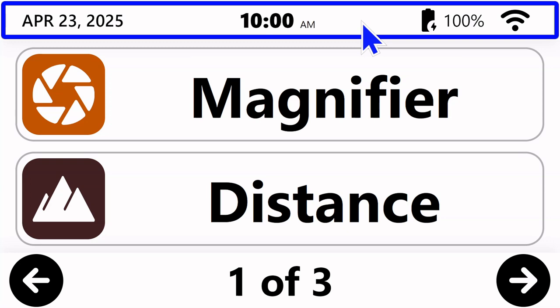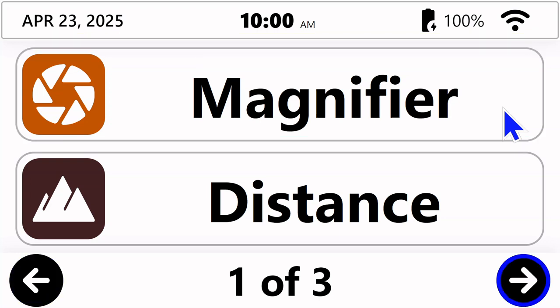And again, Prodigy can be run through a touchscreen on say, a Surface tablet or a PC with a touchscreen. It can be run with a mouse, as I'm using right now, or you can use keys to navigate through. So I can use a tab right now to tab to different elements, and then I can use my arrow keys to activate different functionalities, or my enter key to select.